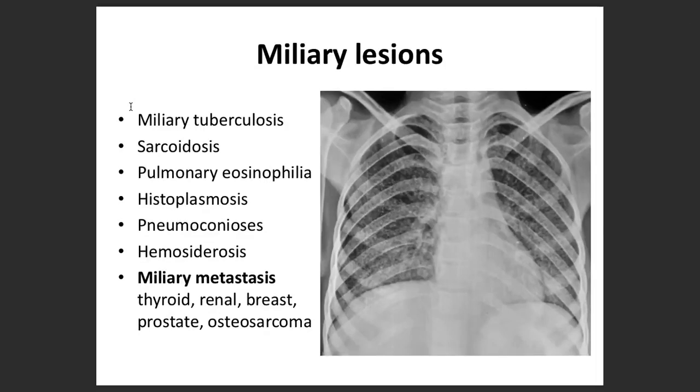So now comes one of the miliary lesions. I think everyone can already say about it. So what are miliary lesions actually? Why is it called a miliary lesion?